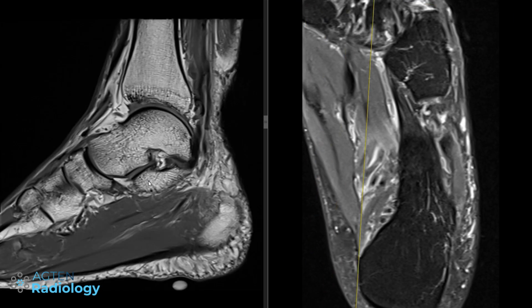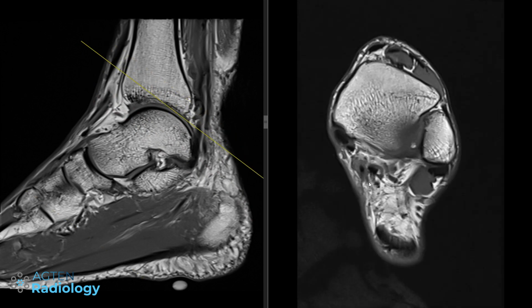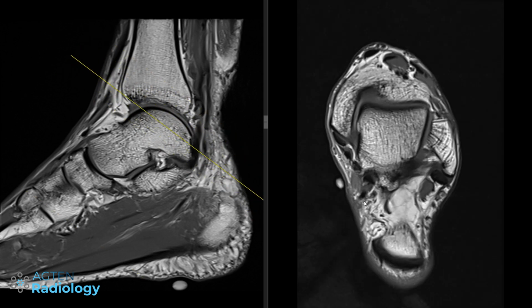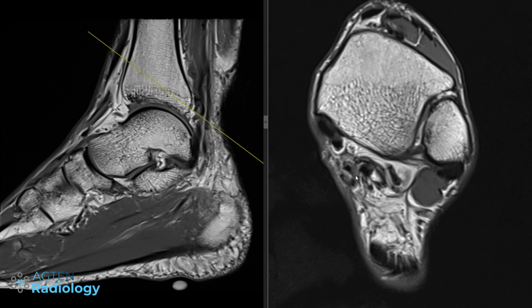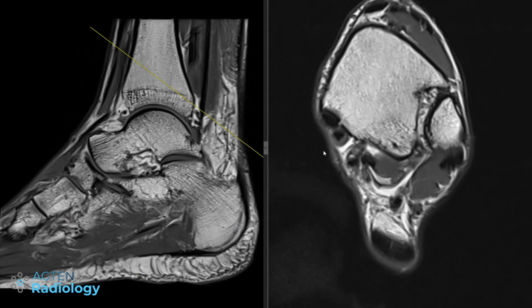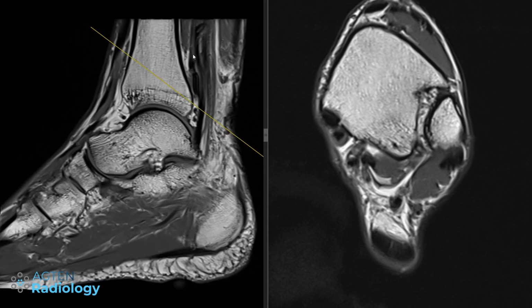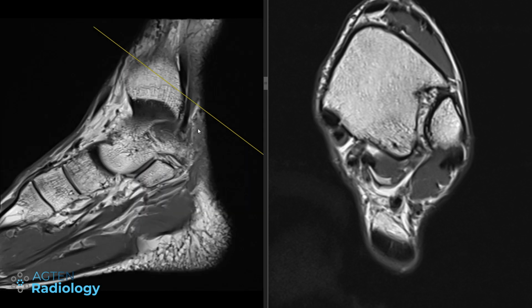Then T1, I'm not sure whether the T1 is actually of any help. We can use a T1 oblique here. And on the T1, what do we see? We see the flow void of the artery here. It's not going high enough to really make a call regarding the flow voids of the veins, but it looks like there's also this low signal stuff.